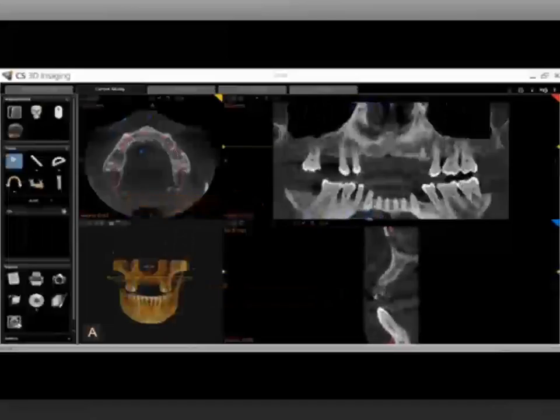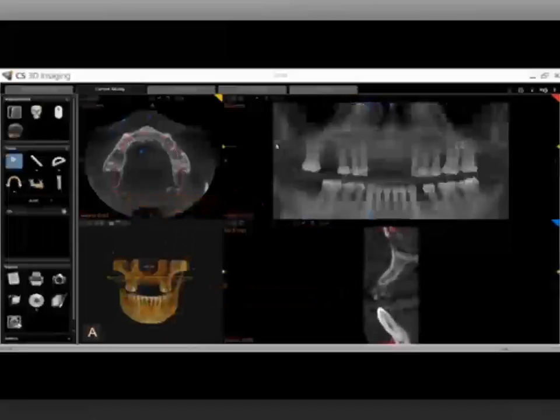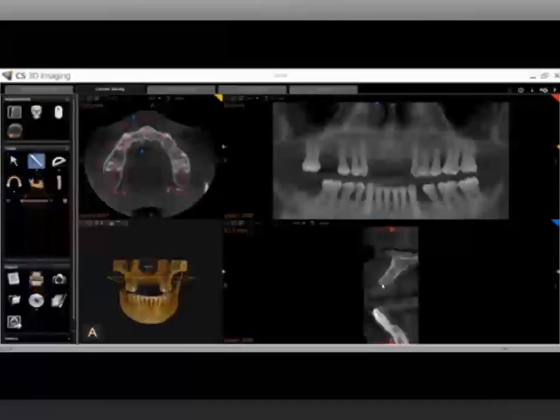Keep in mind that the transaxial view is a cross-sectional slice along the long axis of the blue line in the panoramic image. To evaluate a site for a potential osteotomy, use the large blue ball to move to your region of interest. Click the ruler tool, and then a single left click to start the measurement and another to complete it. You may delete your measurements by clicking the Remove button next to each one.